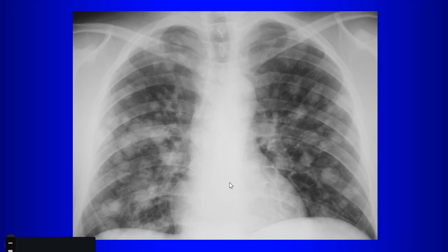All right, so bilateral lung nodules here, what's the differential diagnosis? What could this be? Yeah, your first thought is going to be metastatic disease, right? But is there anything benign that can give you bilateral lung nodules? Well, what inflammatory, what infections? So septic emboli, although you'd like to see them more in the periphery, I guess, and with some cavitation, but what infections are notorious for giving you nodules? Certainly TB, and what other kind of infections? Fungal infections, right. So fungal infections can also give you multiple lung nodules.